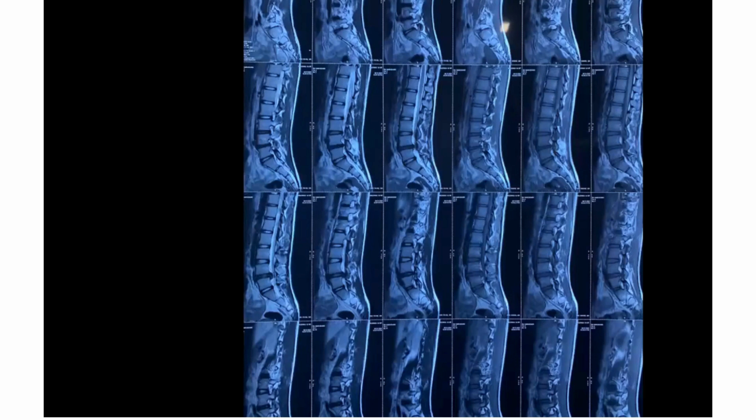Now that we have understood the sections and the sequences, tell me what this is. First, tell me what section this is. Sagittal. Very good. Now, what sequence is this? Is this T1 or T2? It's T2, it's white CSF. Anyone else want to contribute? Both T1 and T2. First column T1 and second column T2. Good.